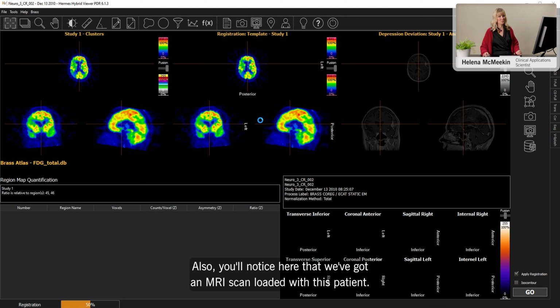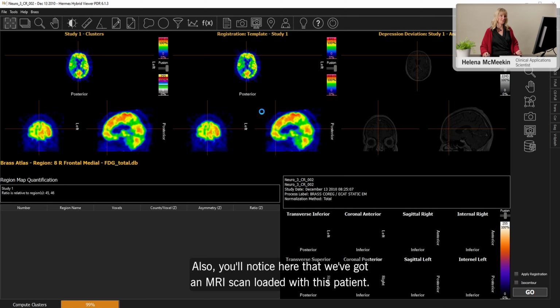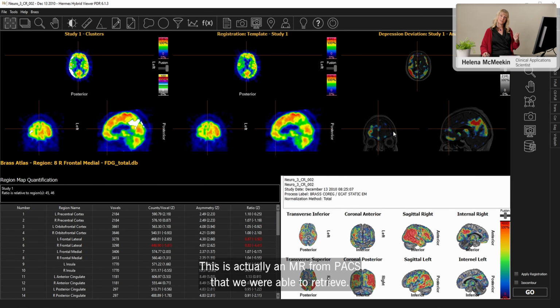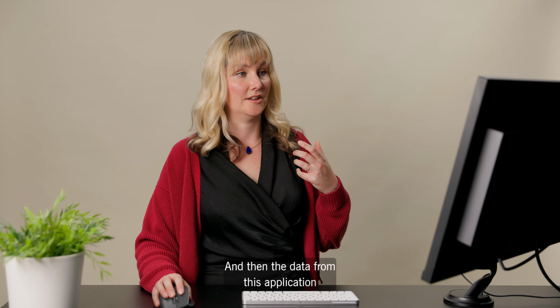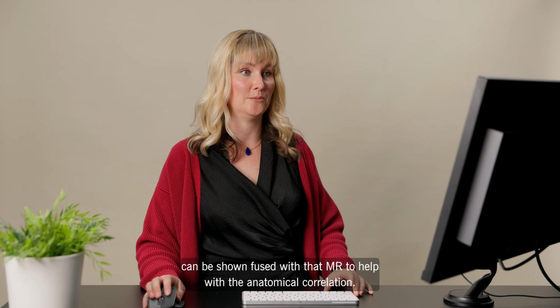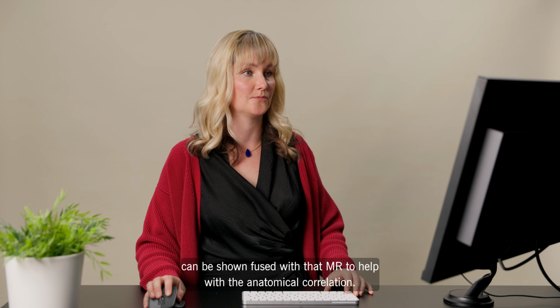Also, you'll notice here that we've got an MRI scan loaded with this patient. This is actually an MR from PACS that we were able to retrieve, and then the data from this application can be shown fused with that MR to help with the anatomical correlation.